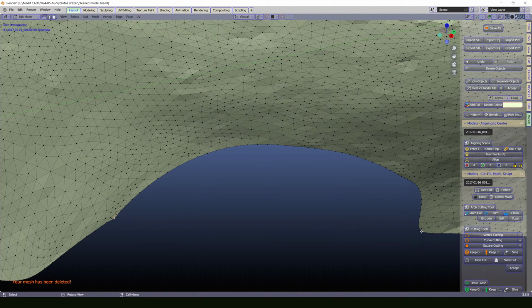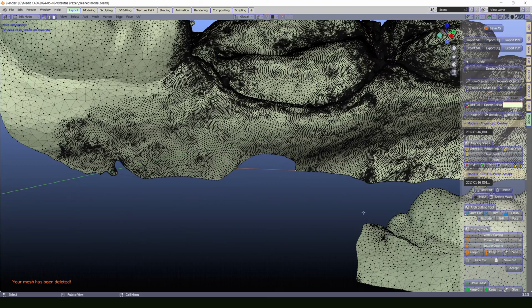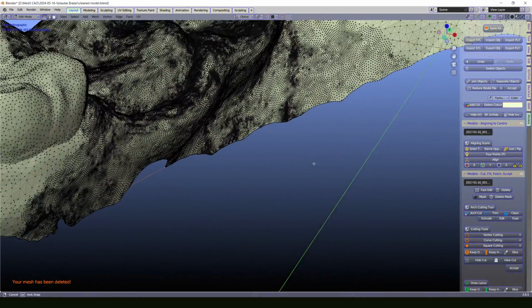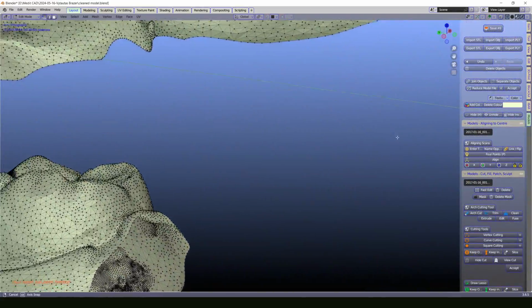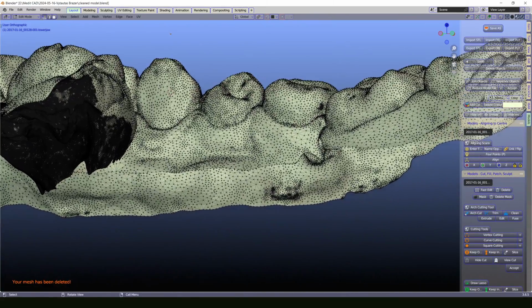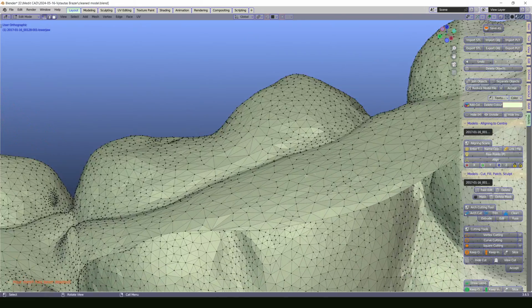Select one, push the shift button, I select another, I push the F button on the keyboard, and I have bridged another one. Let me have a look if I need any other places to be fixed this way. Need to inspect them.